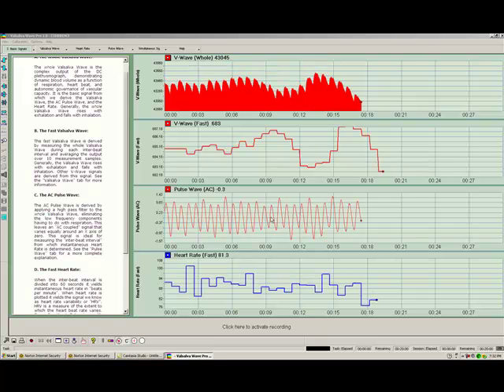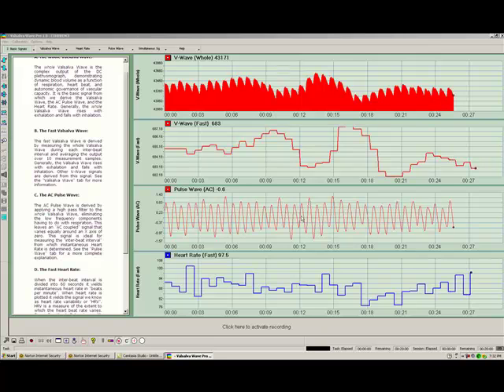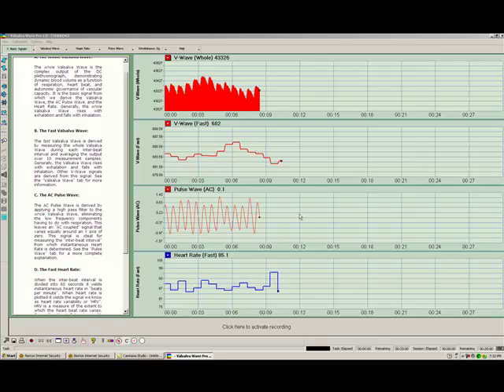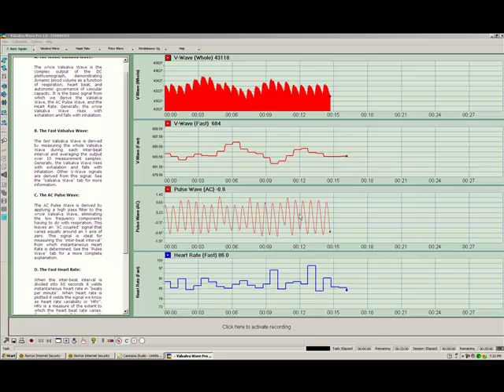You will see in your use of this instrument there will be times when you get a good pickup of the whole valsalva wave, yet the AC pulse wave does not have integrity. Tighten up the sensor just a bit by placing it a little differently, tightening up the elastic band on the finger just slightly, or the same on the ear.